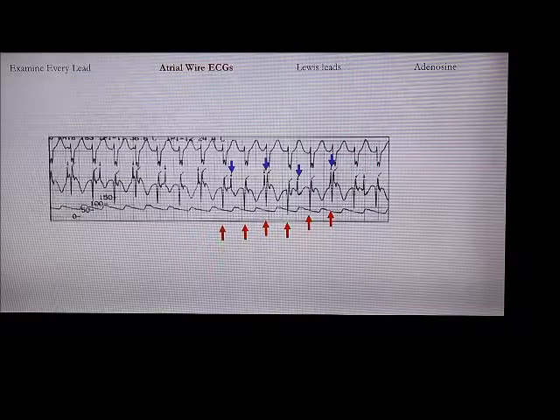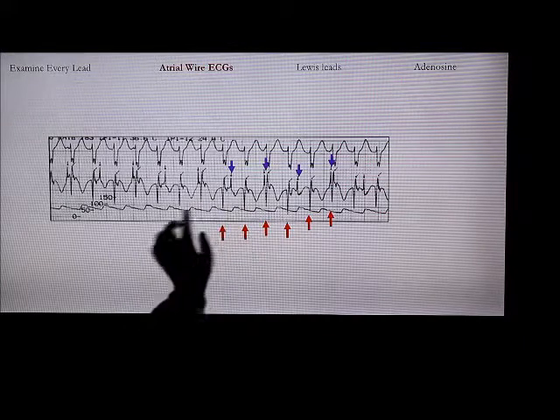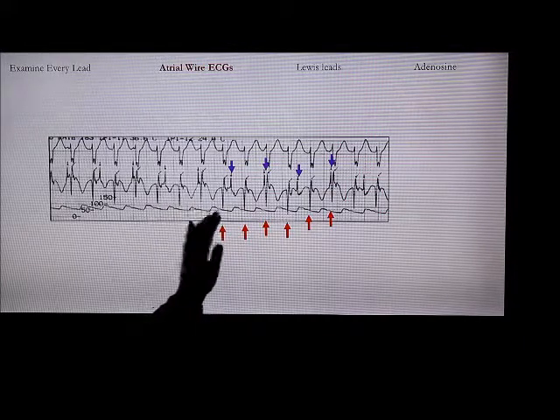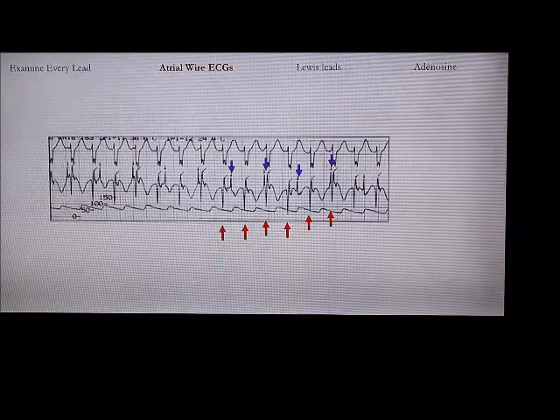Okay, so once you correlate the QRSs, you know that the other spike is going to be the P wave. So here you have more QRSs than you have P waves. The ventricular rate is faster, while the atrial rate is very slow. Okay, so this is a junctional rhythm. But that is if the baseline ECG was not actually sinus.